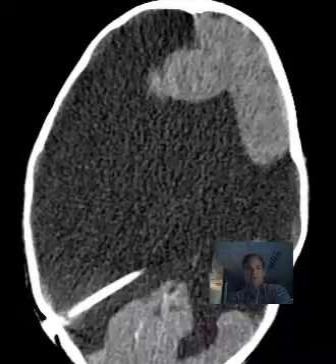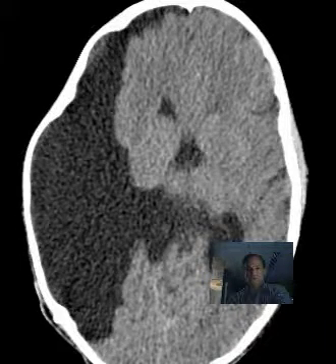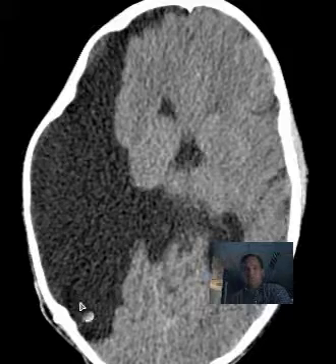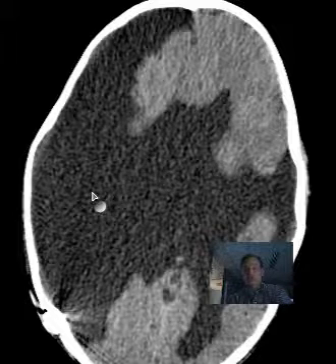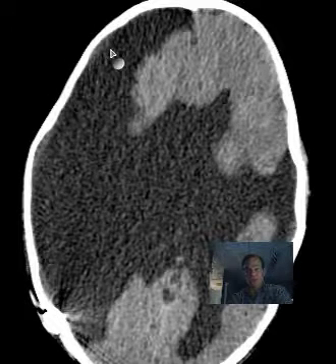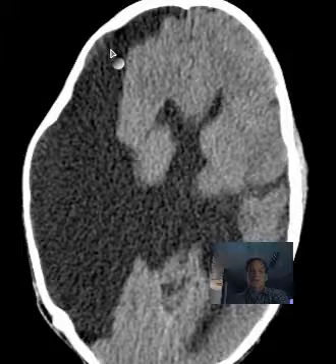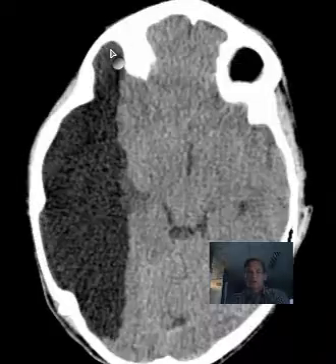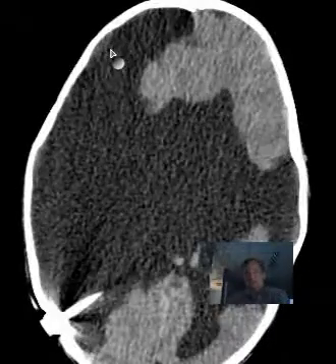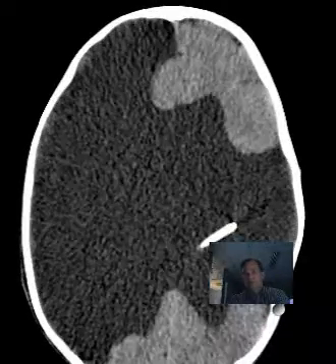So this is an example of a fairly severe case, and if you look here, you get a sense that what has been taken out here is right middle cerebral artery distribution, so I suspect the patient, along with other problems, somehow developed an occlusion of the right middle cerebral artery, either late in utero or in the perinatal period. And on the left, there's similar findings, maybe part of the left middle cerebral artery territory.